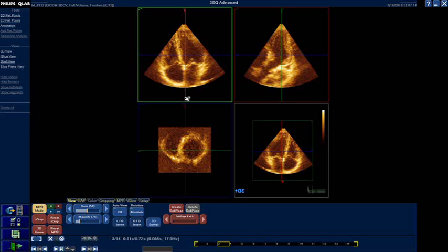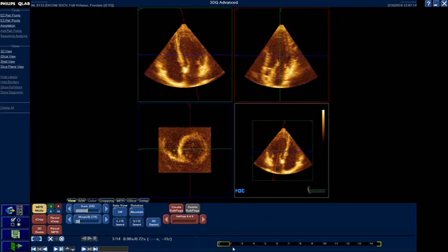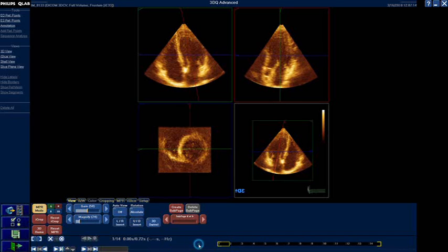In order to do that, we first put our lines empirically in the middle of the left ventricle. We need a 4-chamber view in the green box and a 2-chamber view in the red box. This is the first step, and then we will move frame by frame from here. Frame 1, then 2, and then frame 3 will come like this, to choose the largest one. So for me the largest one was here. This is frame number 1.